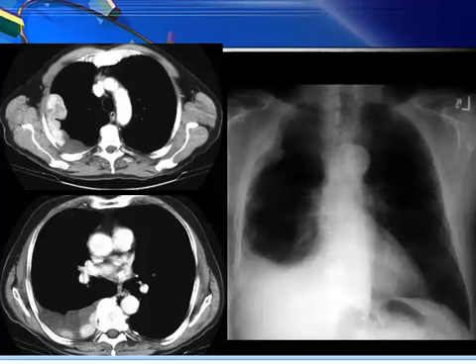So if you have masses bulging from the pleura, continuous with the pleura, with bossy outline, encasing the lung, associated with effusion, no history of empyema, and no history of primary, please consider it mesothelioma till otherwise proved.